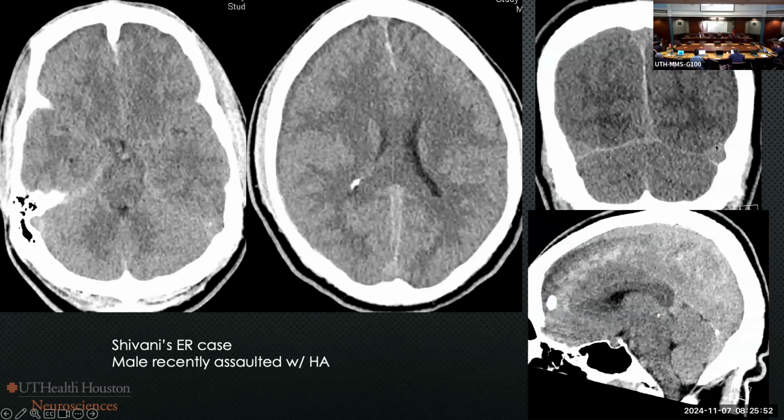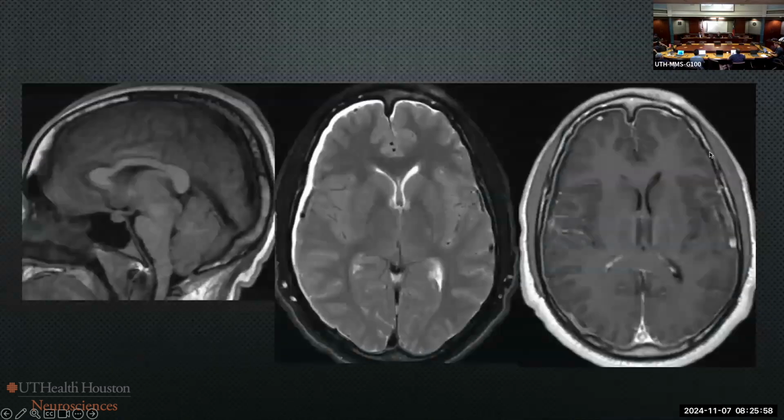When we look at the transverse sinuses, we see that they're ballooned out. So the good news is the next study I'm going to show you is an MRI with no craniotomy having been performed, which probably would make things a lot worse, right? So the classic findings, diffuse dural enhancement. This particular case, he's got subdural effusion, but only on one side.